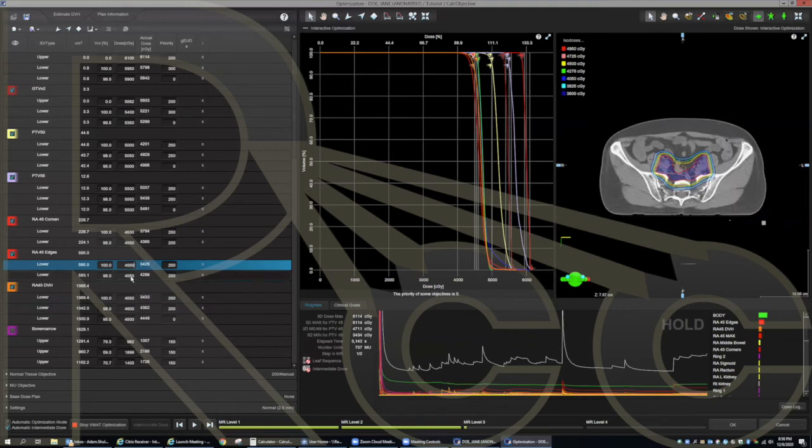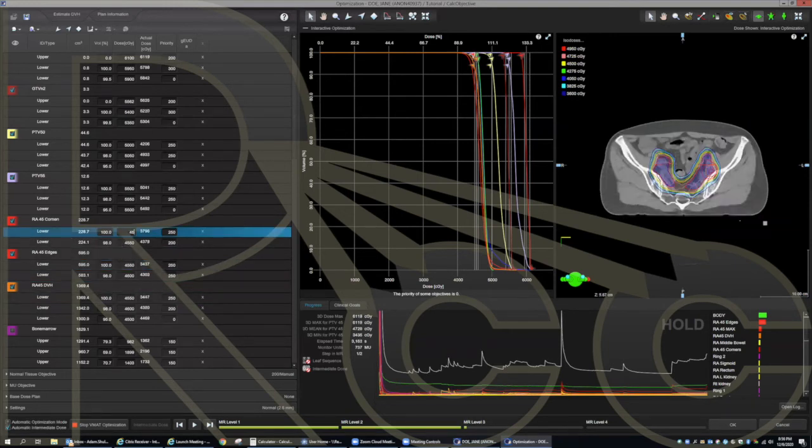Adam, how much time do you spend chasing your tail for these super small changes when you know that you still have to run the leaf sequencer and it will change the doses again? That's a good question. I'll try and get it right now and after. Maybe I shouldn't chase these tails that much right now. But I still want to fine-tune this and these max doses before I get into level 4. So I'll sort of do this process twice.